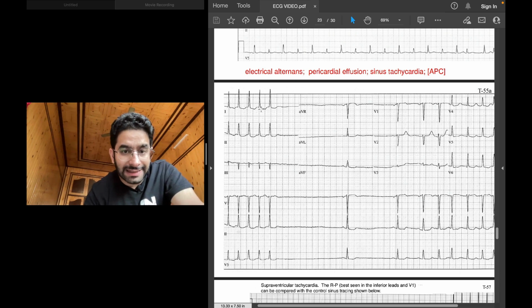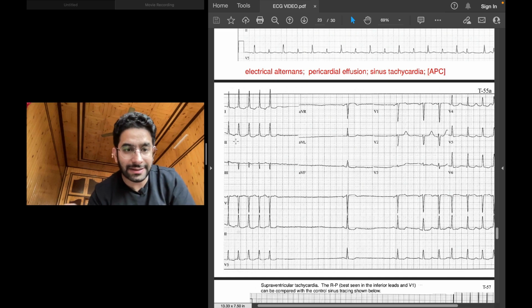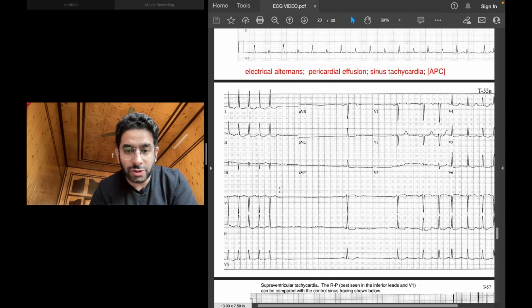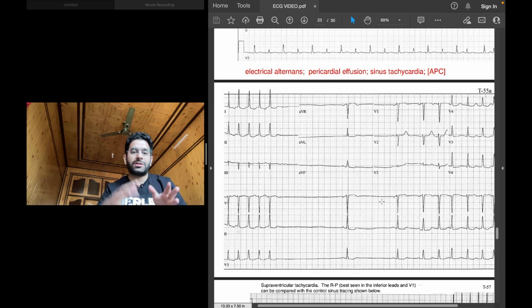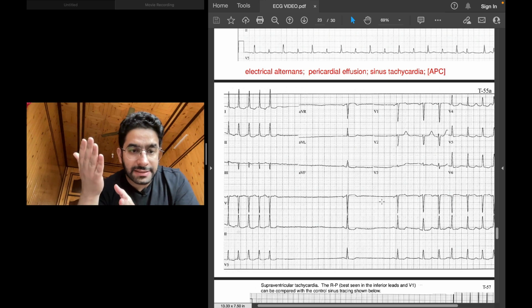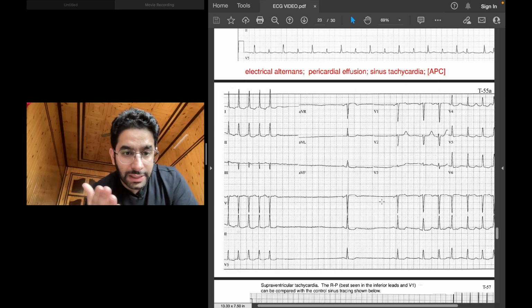Okay, so this patient likely has a run of atrial fibrillation towards the left of the screen. This is an irregular, fast, narrow complex tachycardia, which is atrial fibrillation. And then the sinus node gives a pause. There's no rhythm at all in between. And then slowly the sinus node picks up. This is a patient who is likely elderly, has paroxysmal atrial fibrillation, has simultaneous sinus node dysfunction, and this is what you label as tachy-brady syndrome.